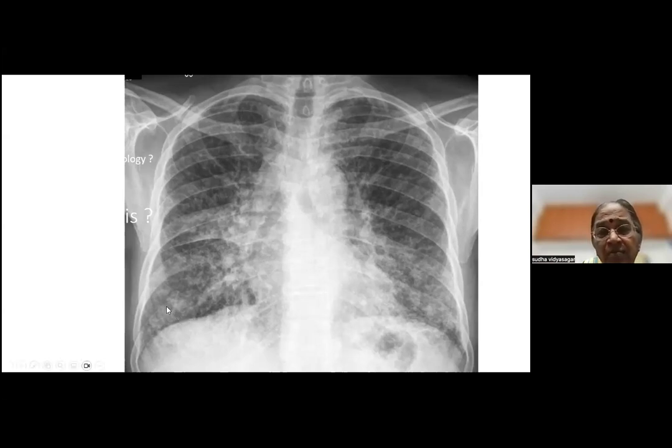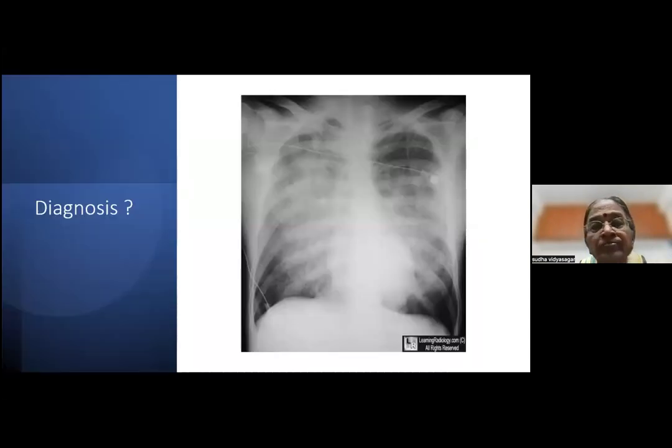You're seeing some traction bronchiectasis here. Lower down, you're seeing round shadows also. So it's a reticular nodular shadowing with bilateral extensive involvement of the lung and probably some amount of traction. It's not a massive fibrosis, it's not white like that. It's like some form of ILD which is in the fibrotic phase. It's not acute.